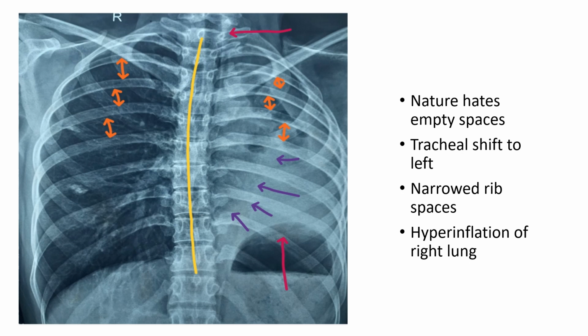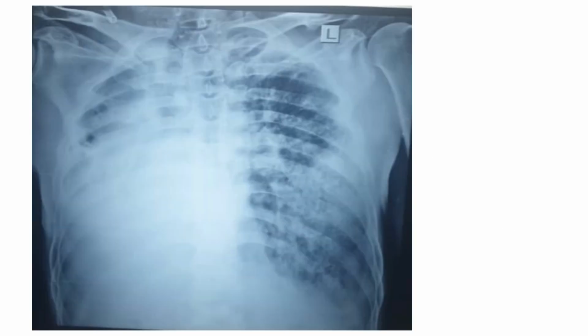Now let's move on to other X-rays, and I'll be pretty fast. Basically, I want to make your visual memory very good by seeing multiple X-rays. So we'll tell about the key features and then move on to the next X-rays. Okay. So here, just first see grossly.